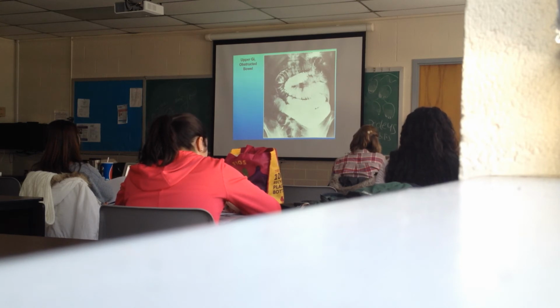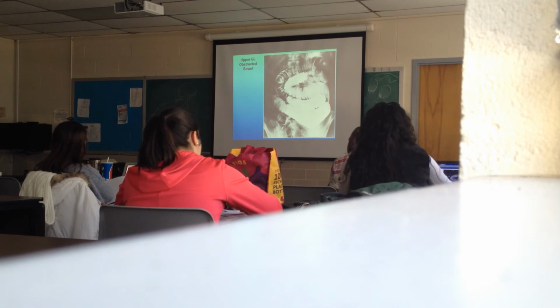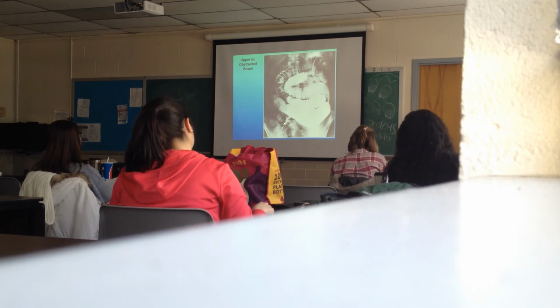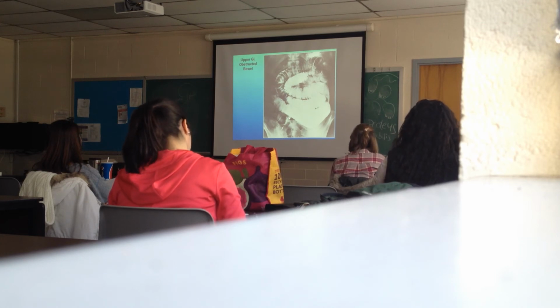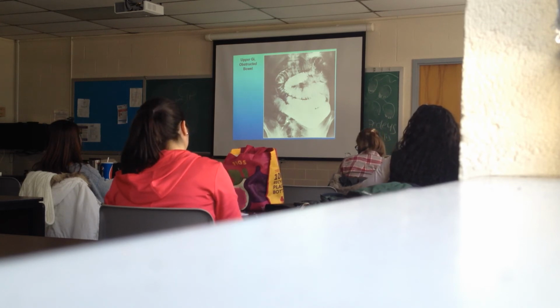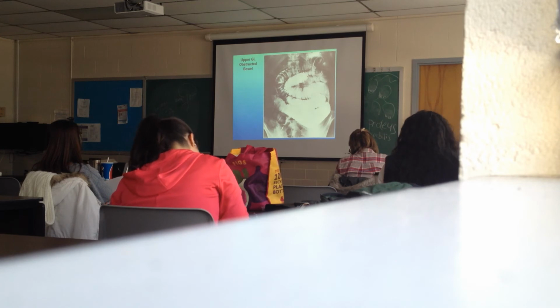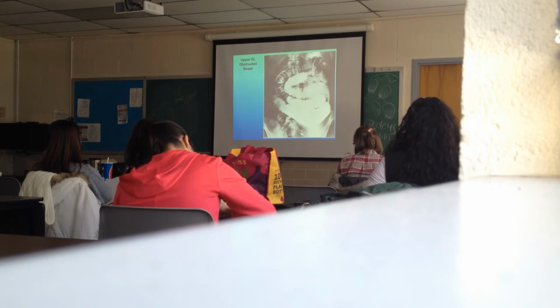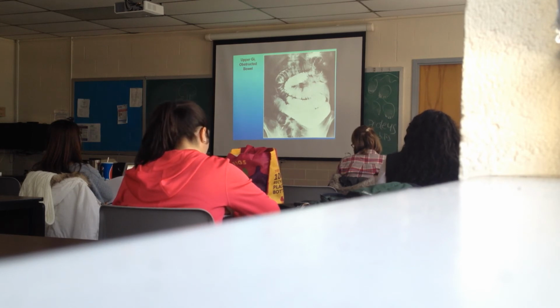Okay, lots of distended loops of small bowel due to a bowel obstruction. You can see the small bowel because it's filled with barium. And at this point, there's a point where you can't visualize the bowel anymore. This, of course, is where the obstruction is. No barium can pass into the obstruction. So you can see that most of the bowel here without barium is going to be pretty radiolucent.